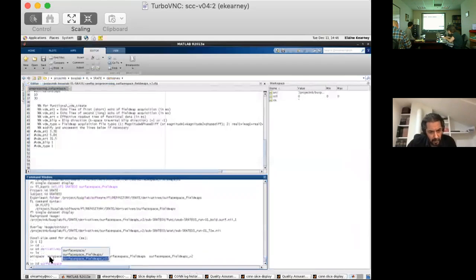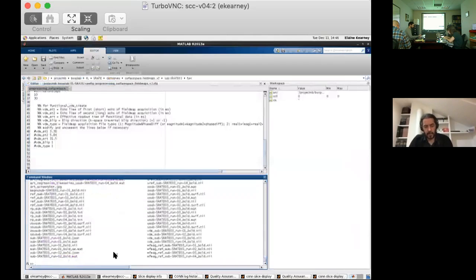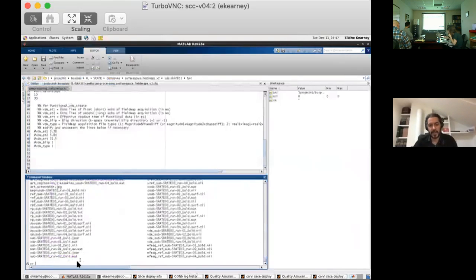It doesn't matter which one because we are going to look at just the JSON files, and then in whichever subject, or well, this subject, since we are working on sub 3, and then the func folder for the functional data, and then look at the JSON file of the raw functional data. You should have like 4 JSON files in there, probably for the 4 runs. So see where are they? Yes, here. Right, excellent. So just look at one of those JSON files.